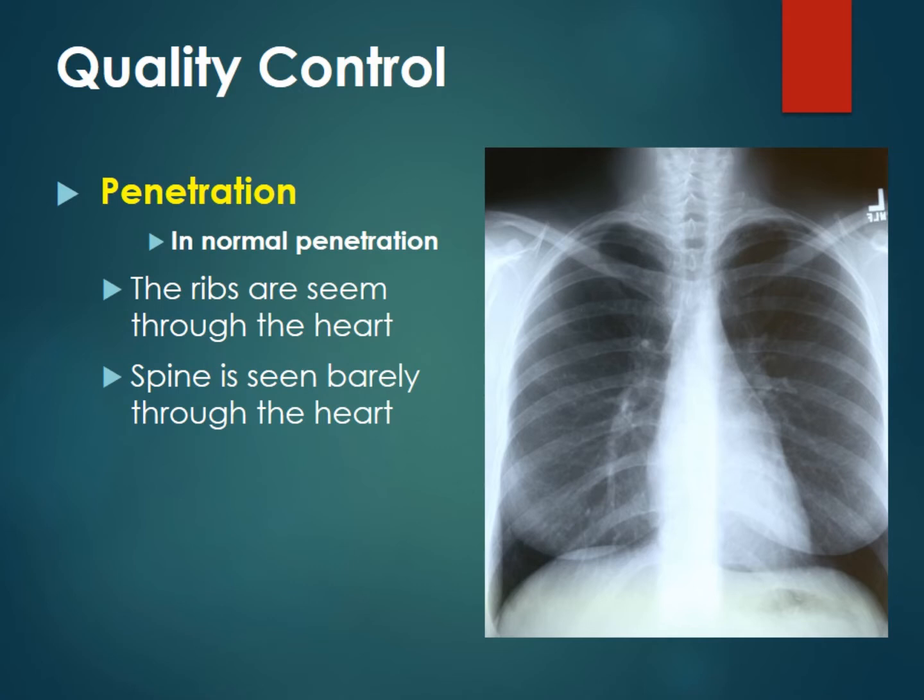Then comes the quality control. We need to ensure certain things under quality control before interpreting an X-ray. The first important thing is the penetration. Now, whether the X-ray when taken was normally penetrated or under or over penetrated.